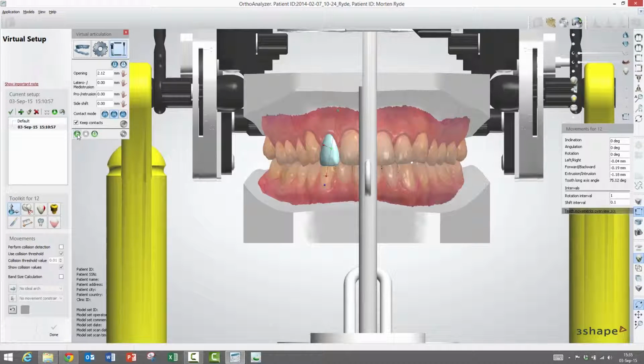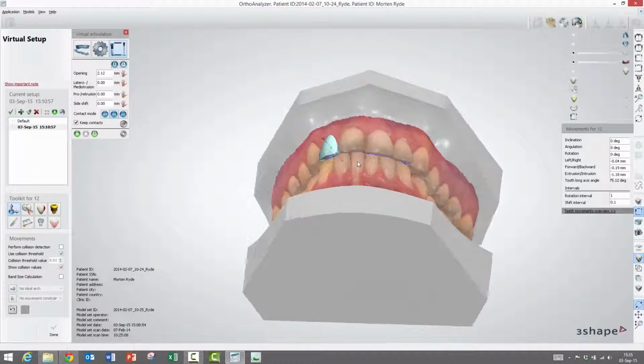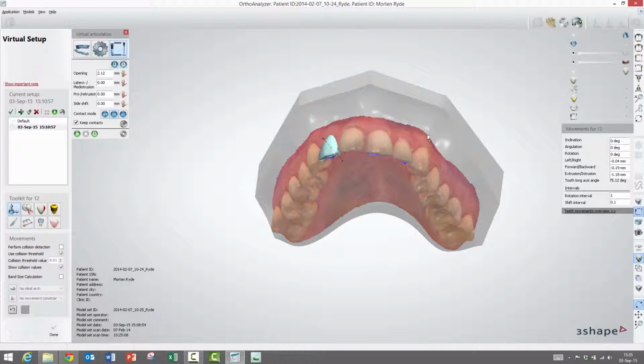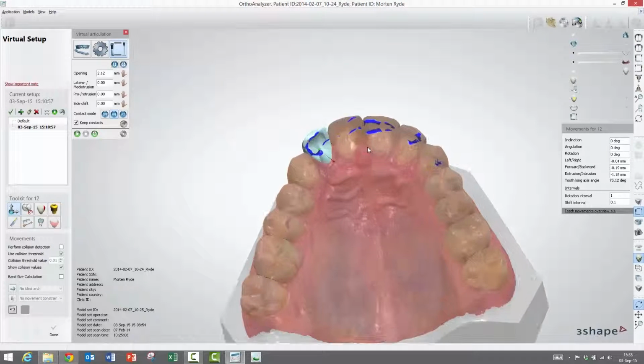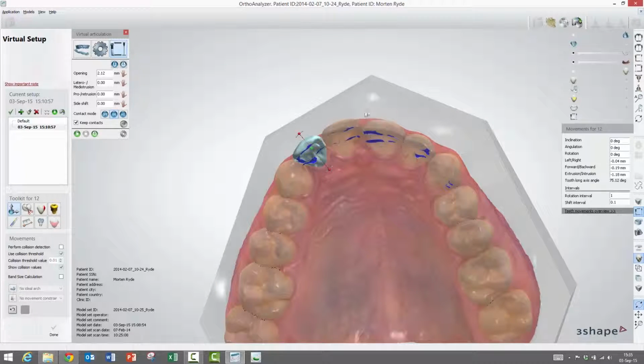Yeah, just like the occlusion map tool, you can see where the contacts are. So here, I can not only hide the virtual articulator, that will probably ease the process to view exactly what happened, but also hide the mandibular model and go directly. Right. There we see it right away. Exactly. So this is why it is very important, in my opinion, to keep the contacts so you can see exactly why it collides and correct it at will.